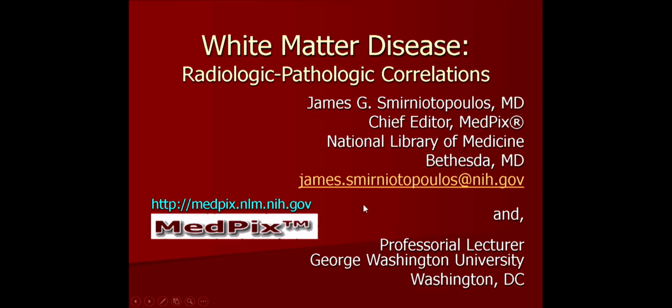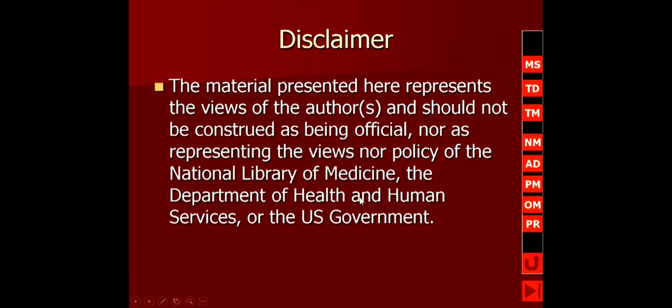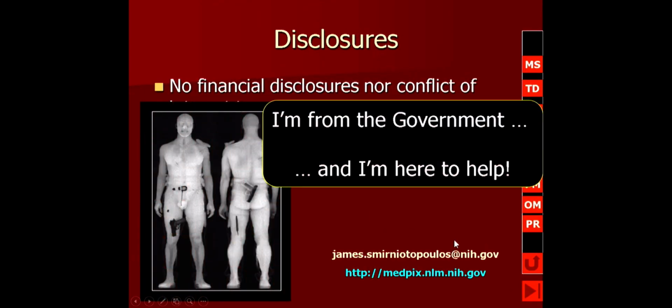To emphasize something about the clinical appearance and the imaging appearance that are going to help you make a differential diagnosis for white matter disease.